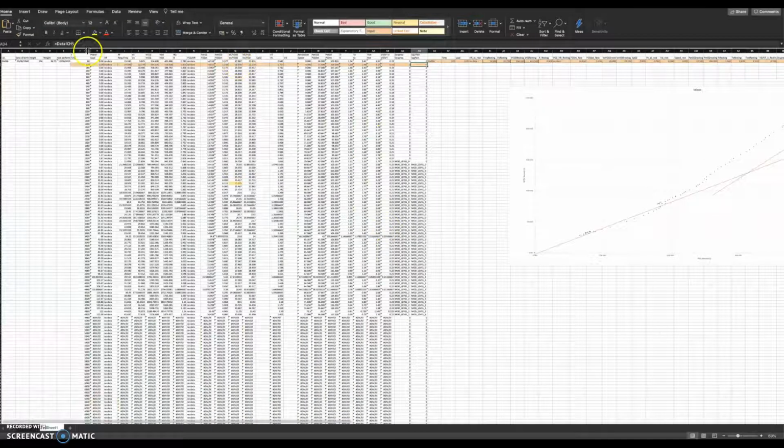Okay, so you just need to confirm that all these things are the same, okay? Mainly these things here, and these two. That needs to be the same as that. If not, there's some kind of problem somewhere. But normally they're okay. If you do those few checks, I'll send you a photo of those few checks you have to do.